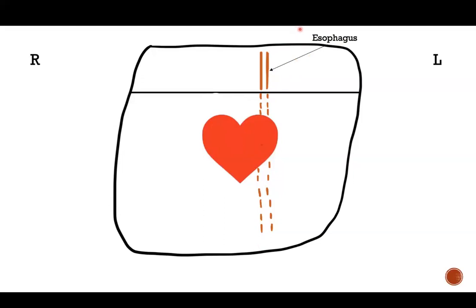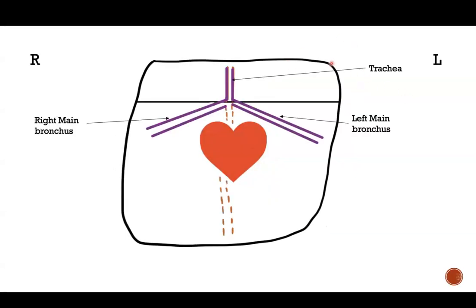Now, this is also a very important identifying feature of the esophagus, because when we're coming to look at the cross sections from the CT, you'll notice that the thing that's always the most behind, next to the vertebra, straight away, is the esophagus. Okay, this is a good way to remember it. Now, the trachea, it goes with the esophagus back to back. Okay, it's esophagus behind, and then right in front of it, sticking to it, is the trachea.